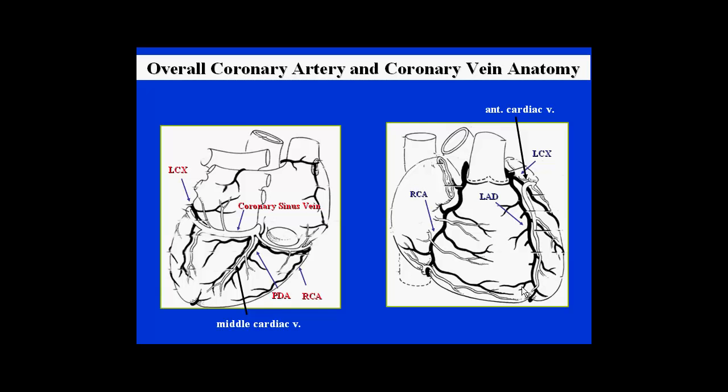Importantly, though, when learning to understand coronary anatomy using tomographic imaging with cardiovascular CT, it must be appreciated that the relationships of the arteries to each of the branches is important, but also the location of the various veins and vein connectors which intersect or burrow in close association with the arteries, so as not to confuse which vessel is which.